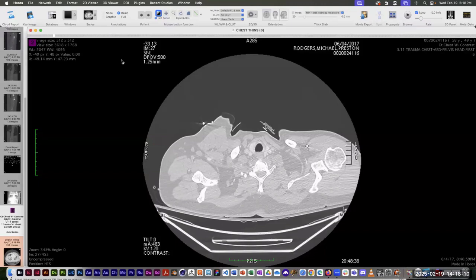What I realized when I started tabbing through these things was that the difference between each image in the series was either 0.62 millimeters or 0.63 millimeters. And what it turns out it's doing is it's rounding, right? So the actual spacing is 0.625 millimeters.